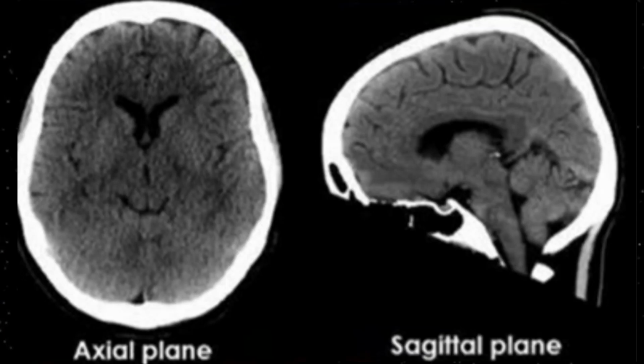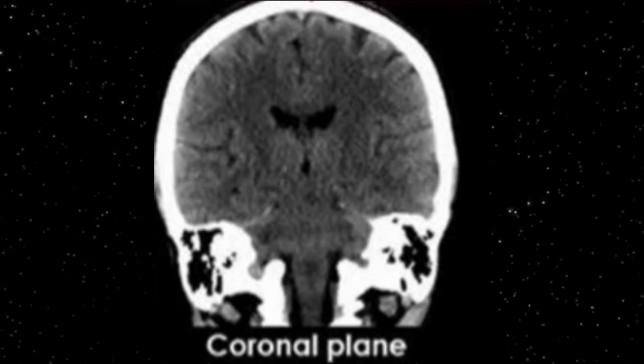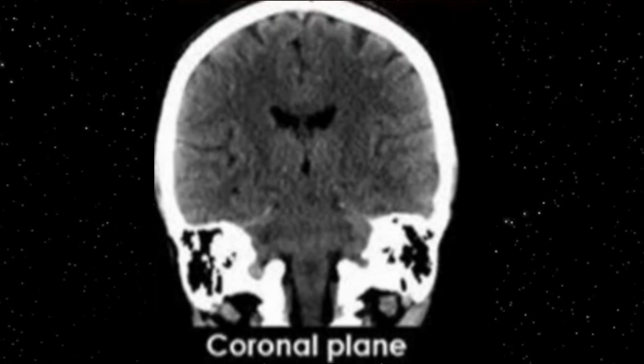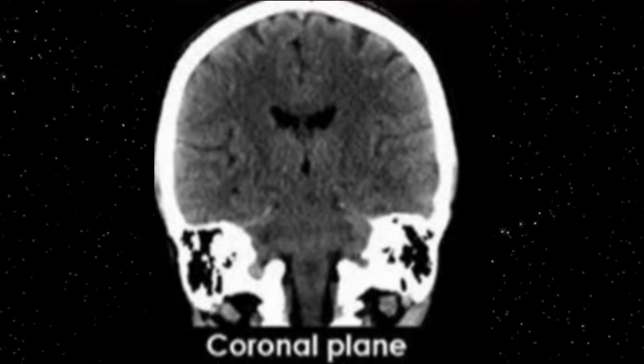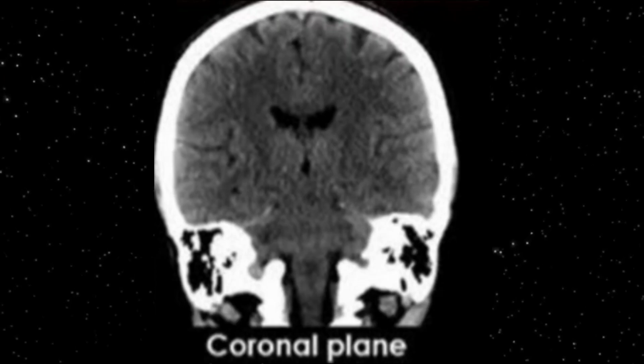Normally the machine cannot make the sagittal and coronal planes itself. It will only provide you the axial plane. Here on this image you can appreciate the coronal plane. So these three planes are important for study and survey purposes.